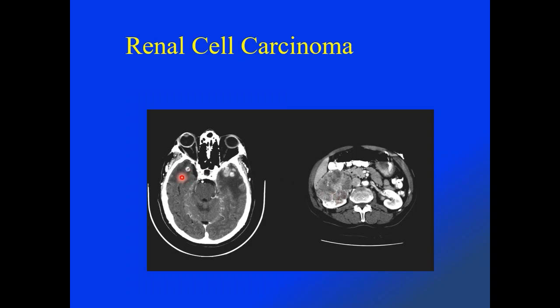This patient presents with multiple small enhancing parenchymal lesions within anterior temporal lobes bilaterally with large areas of surrounding edema. There's likely also a metastasis within the superior vermis with associated edema. And this patient was discovered to have a large right renal cell carcinoma.